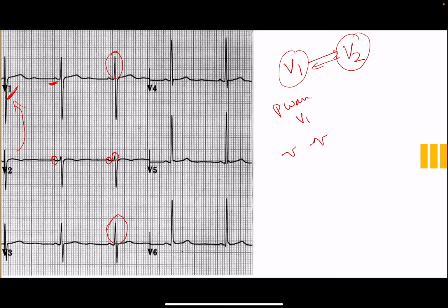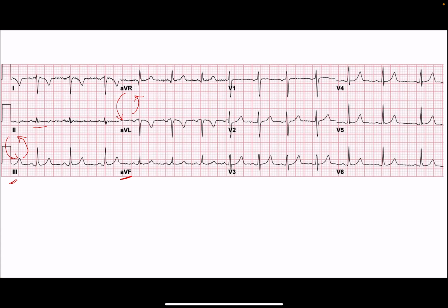This is very important because with new T inversions or a new change in axis, you should not suspect a new abnormality. Someone can give a casual look at this ECG without noticing that the P wave is negative here. They may think it's some lateral wall involvement, or if they don't see this V6, they may think there is some ischemia in the lateral wall. So always identify the lead reversal, and always have a look at the P wave.